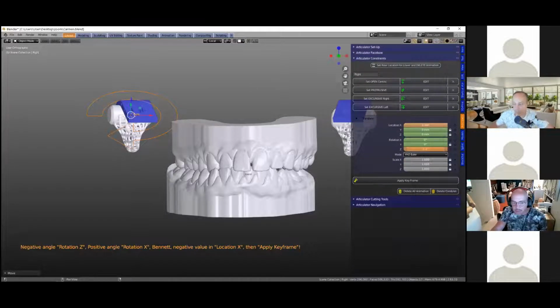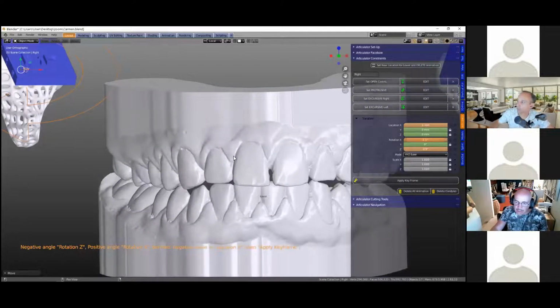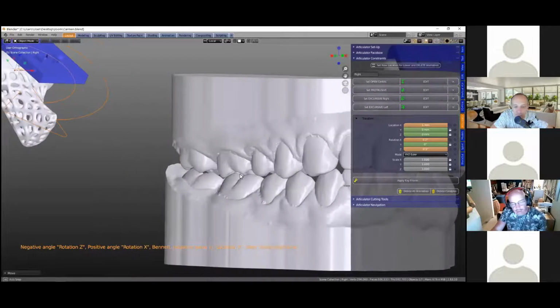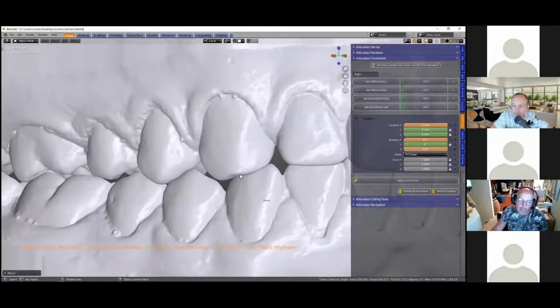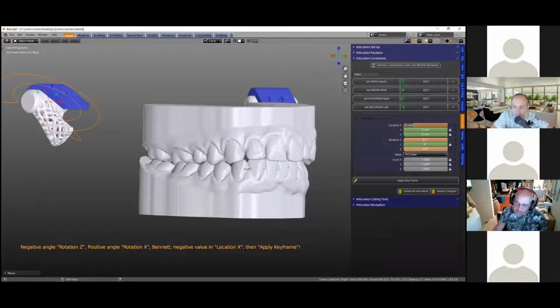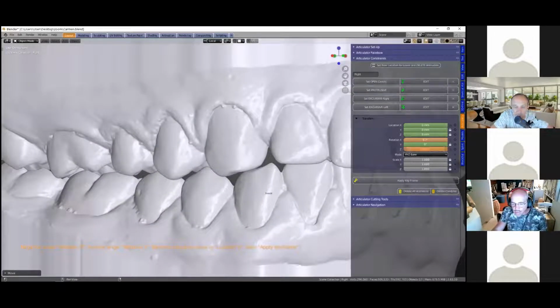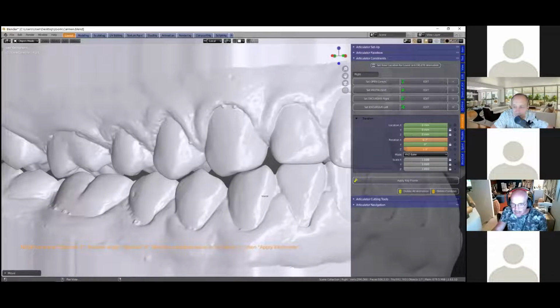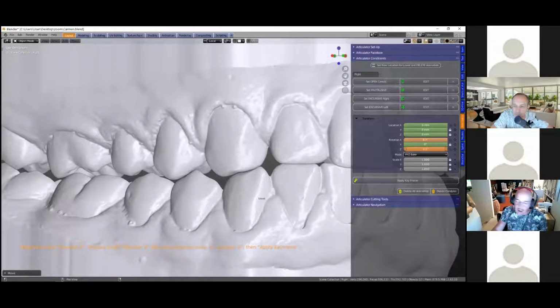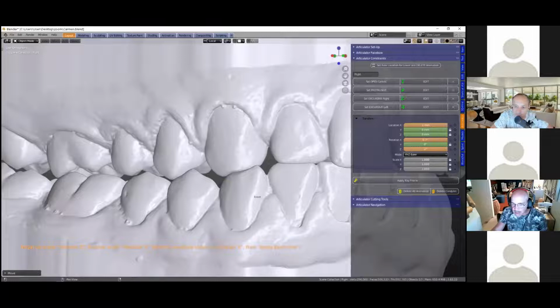And we're going to just move this way. We're going to open it up that way. Now, the interesting thing is here we can see that we actually got it in the wear facets. I found that fascinating the other day, and I called Wolfgang up and said, you know what, Wolfgang, if you don't put the Bennett side shift in, we don't get the wear facets. This is quite amazing, because if it's a 0, you can see there's no way I'm going to get these. Even if I move this jaw, you can see how it skips past the actual wear facets of the mouth. So this is actually quite exciting. I thought this was exciting. So I've put that at -1 so we can get that exactly correct like this.